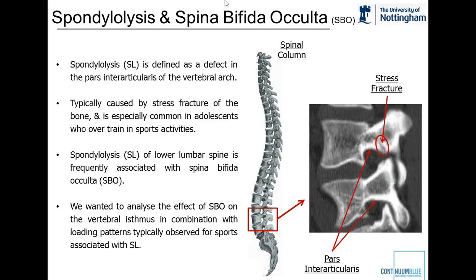So what we simply did in COMSOL is we imported spine models from a patient-specific scan, similar to how we did the bone remodeling earlier on. And we simply applied a vertical load and a rotation. So this is somebody that's running along and jumping up and down and then turning at the same time, such as seen in fast bowling in cricket. We only modeled the L4 to S1 components of the lumbar, and we loaded the lumbar section up to 1 kilonewton and a 3-degree rotation.